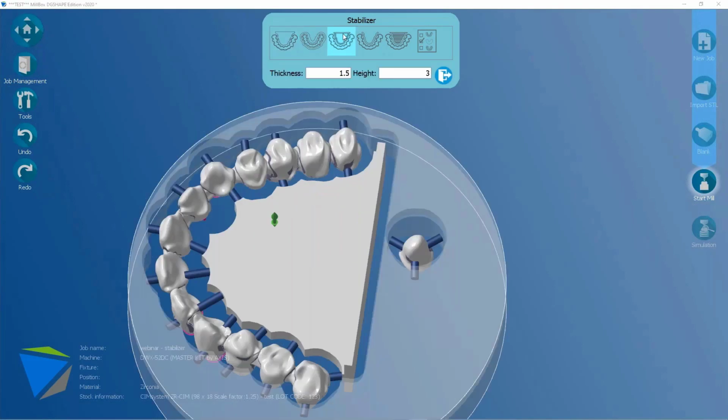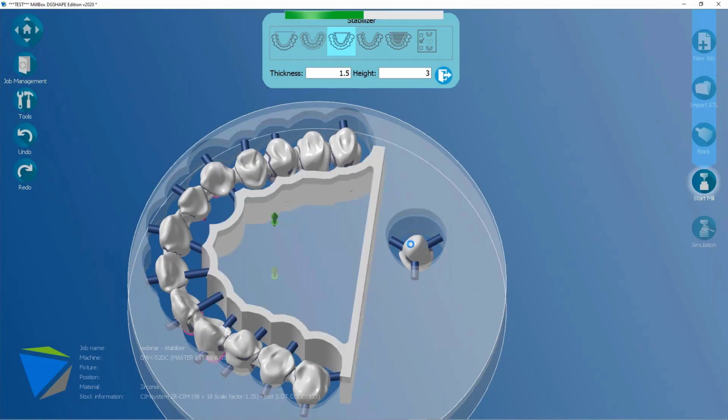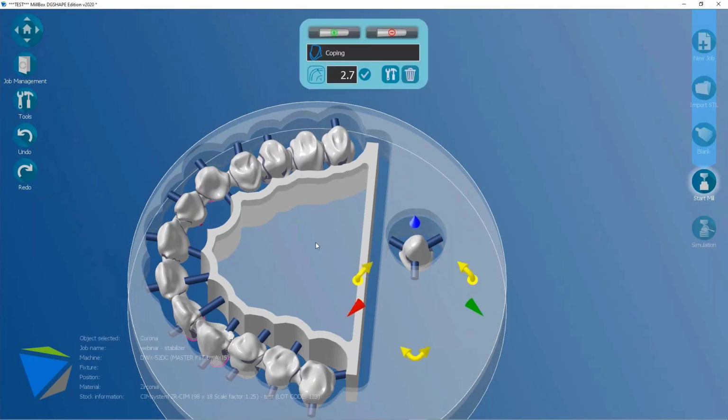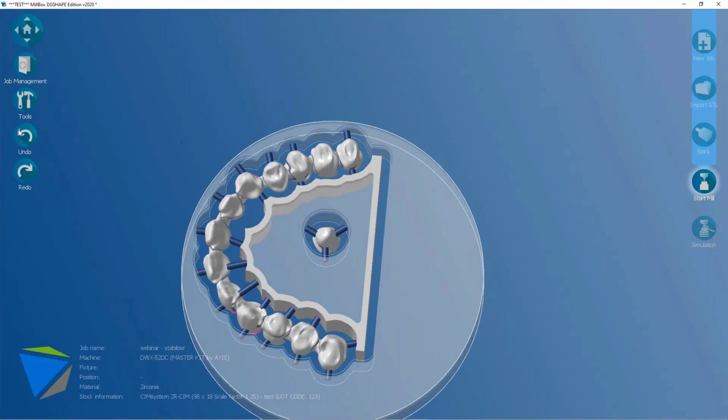Okay. You also have the chance to put in the middle, thanks to this opened area. I remind you that you have the chance also, after the confirmation, to put in the middle any kind of other object in order to use even the internal area. But let's go back.